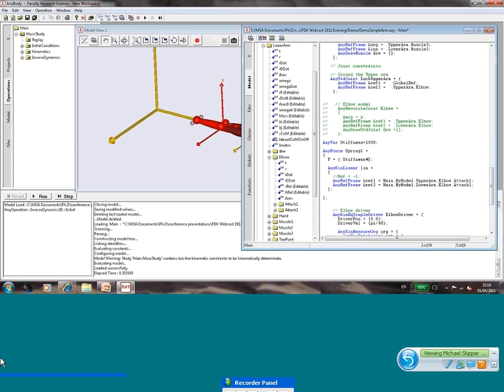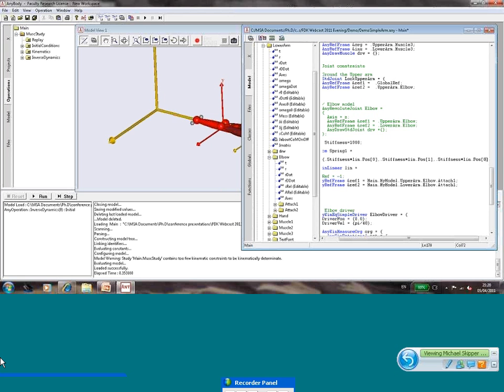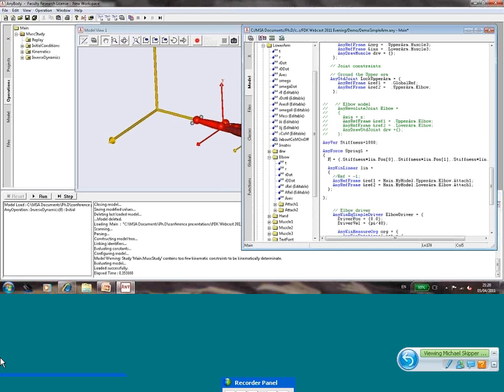times the position in my linear object. So I write linear, and then within this linear object there is actually a position variable. So this one here with square bracket 0 will give me the x coordinate, and if I put in the next one, 1, for the y component, I get the y component, and then I put 2, then I get the z component. And then because we want the spring to pull whenever the vector gets longer, then we need negative values. We need minus in front of all these things. So this one was our first spring.